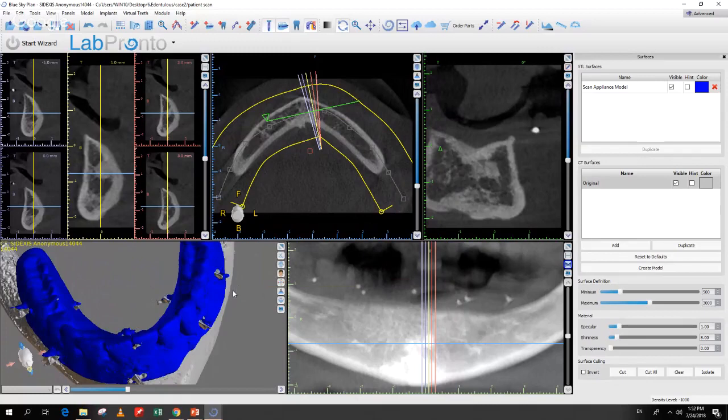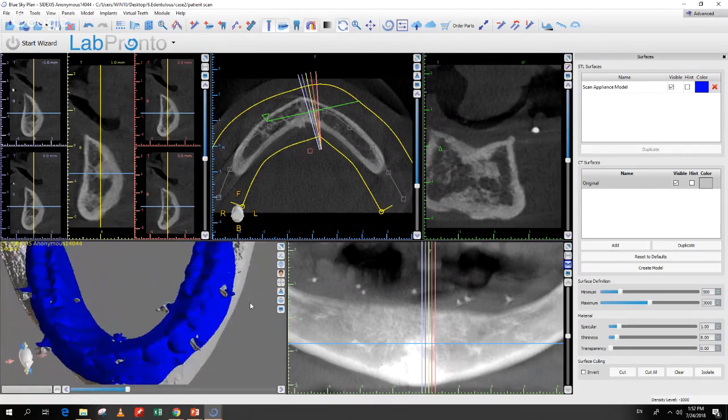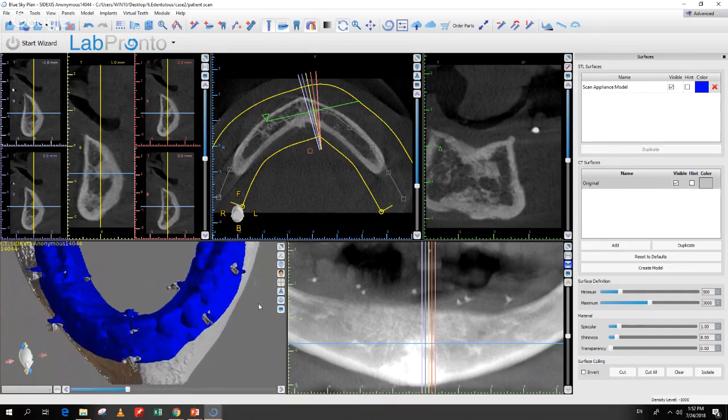Okay, so the points fill the void of not being able to align teeth or not being able to clearly annotate particular points in the scans, just like we showed at the beginning. When we had the teeth, we were able to use the teeth to help with the merge, and we were able to merge the teeth or find those clear points in both scans. As we discussed, the edentulous cases don't have that. So the markers are coming to fill that void and to give us that proper alignment between the two scans.